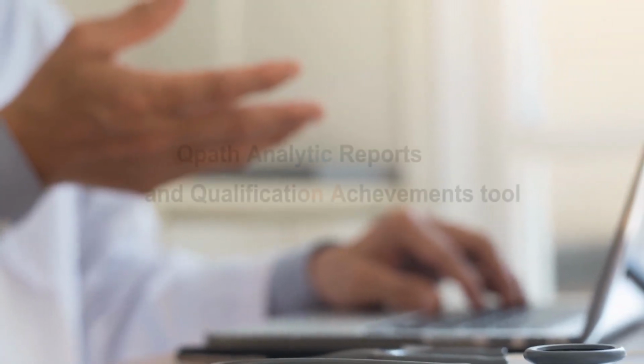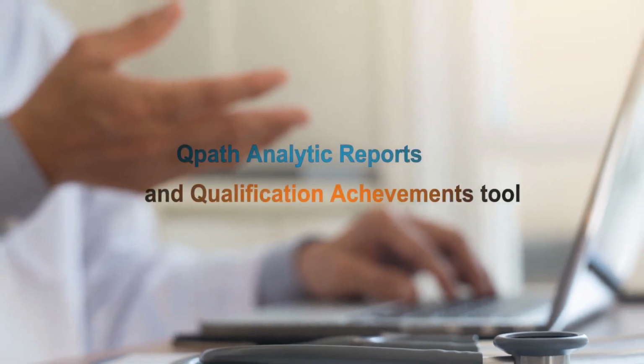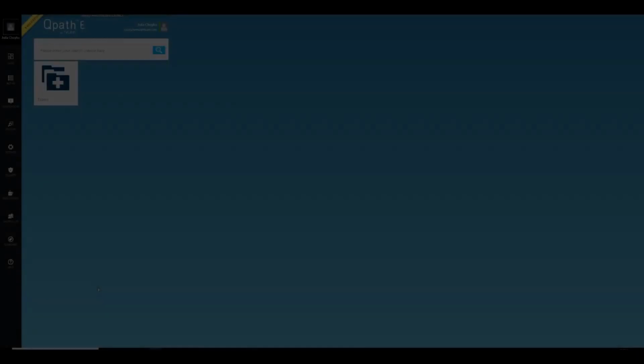You are watching Qpath E demo. In this video we will show the reporting tools in Qpath E.